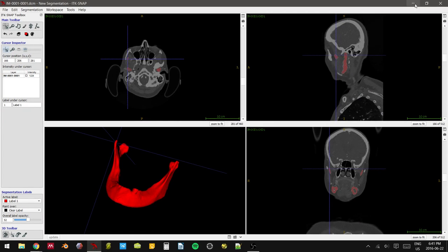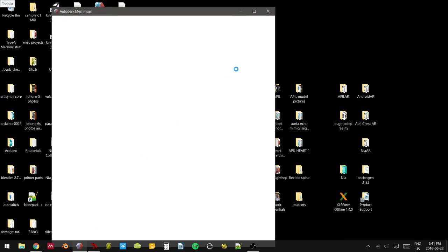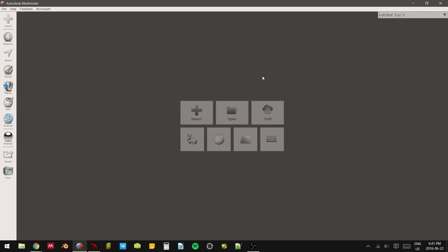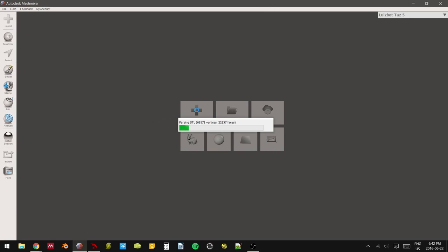Okay. We're gonna do some editing inside Meshmixer now. So launch Meshmixer. Okay. So we're gonna prep this for 3D print with one caveat. So to get your STL into Meshmixer, you hit import, find your file, or you can drag and drop it into the screen, doesn't matter, but for our purposes here. This loading bar shows you that it's a fairly large file, like it's fairly detailed.